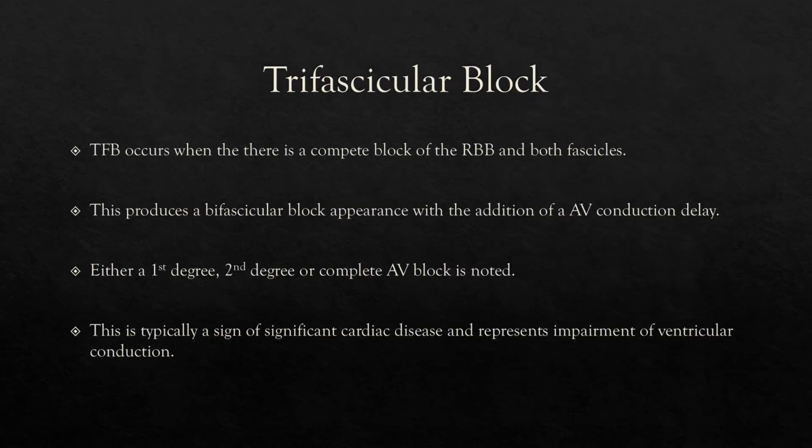And then the trifascicular block. So basically, anytime that you have a complete block of that right bundle branch and both of your fascicles, we term that a trifascicular block. Okay, now this type of blockade will also cause a significant AV conduction delay.